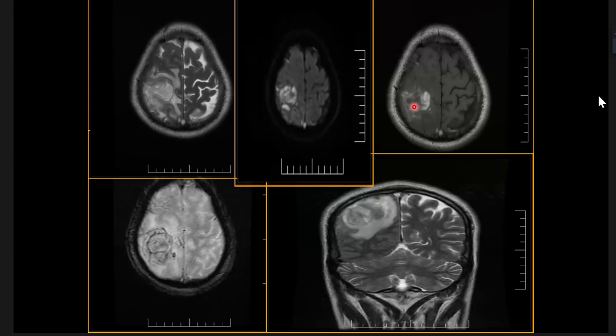Very good. I mean to say, what flow voids do we look for while seeing the scan on T2 weighted images? Do we look for arterial and venous flow voids? So this is the transverse sinus, correct? This is the right transverse sinus, blackish. What is happening to this sinus? Superior sagittal sinus. Very good. T1 hyperintensity is there, sir. Likely thrombosis. Very good.